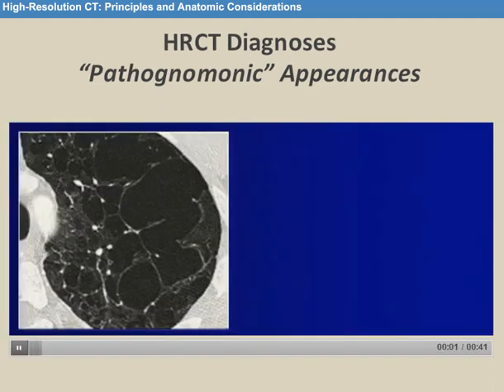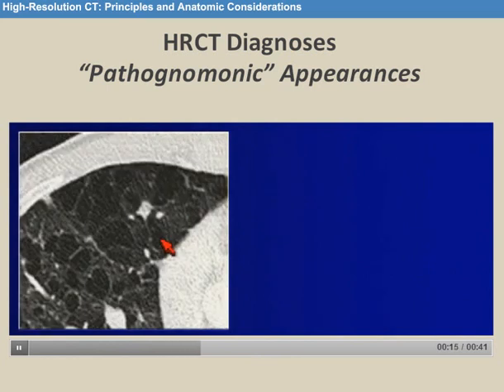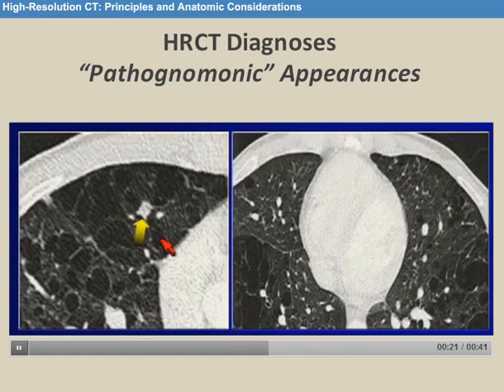But there are some other features. If you look at these cysts, they do have very bizarre shapes. For example, if you look at this, it doesn't quite look like a cyst. This looks like a slightly twisted, serpiginous area of decreased attenuation. If you were very eagle-eyed, you would have seen on one of the sections that in amongst those cysts there are some nodules. And again, distribution.